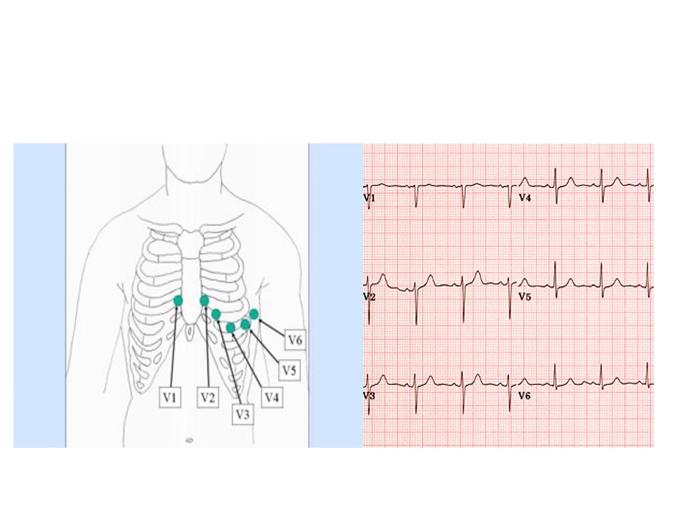Lead V3 is a little bit downwards from lead 2 and more to the left, so we see more positive charge, and then more in V4, and then V5 and V6, as those leads are looking more and more towards the apex of the LV, where the majority of the muscle mass is. You can see in this particular ECG, lead V5 is the biggest, which means that the apex is pointing in the direction of V5. Sometimes it's pointing a little bit anteriorly at V4, sometimes a little bit posteriorly at V6. Most of the time, it's going to be somewhere between V5 and V6.